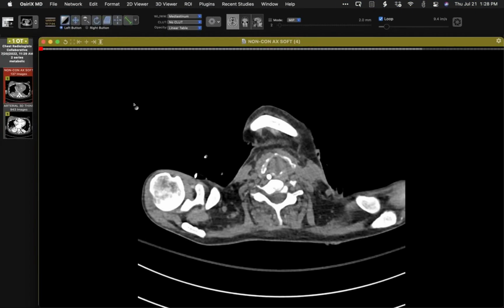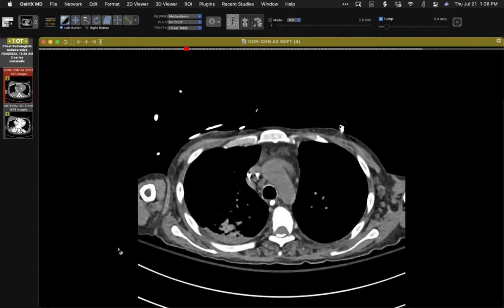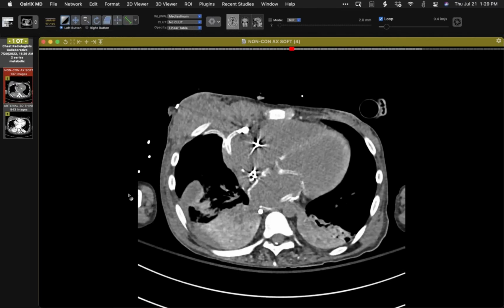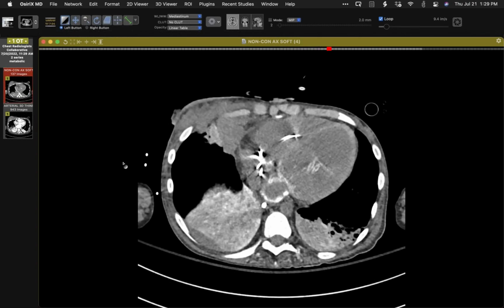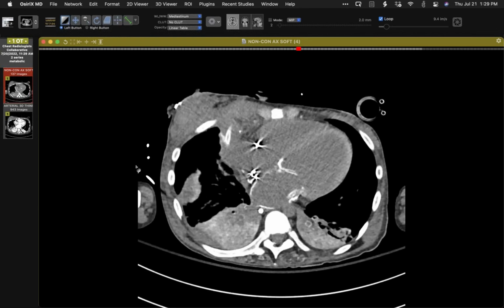Okay, I'll start with this one. Now, I'm going to withhold some information about this patient. I'll tell you that all the tubes and the surgery that you see here was the unfortunate result of a patient transferred here, as best I can tell, at the initiation of a certain surgical procedure, which I'll mention in a moment. Things didn't go well.